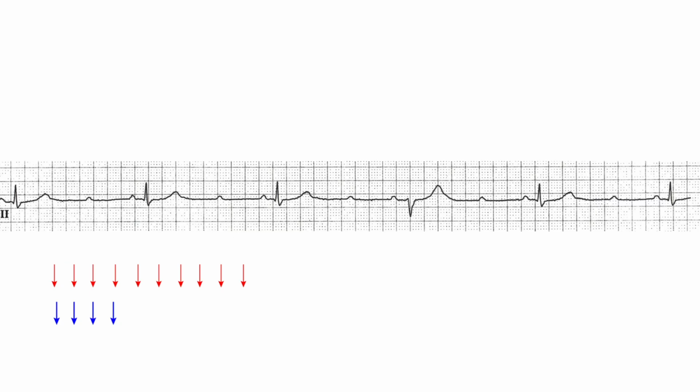Okie dokie. So somebody hands you this strip, right? Now, if you watch the rapid ECG video, you already know what this is. Here we're going to be going into a lot more detail, I would say. I'm not going to be revealing anything profound or new, but we will be going into a little bit more detail, actually a lot more detail.